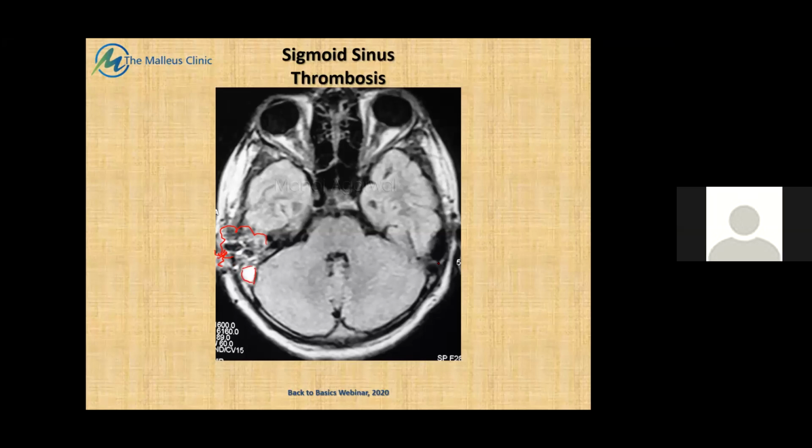You can see that the lateral sinus on the other side is not visualized even on contrast because of the rapid blood flow, but on the right side, because of the sluggishness of the blood flow, the contrast has accumulated in the lateral sinus, leading to a hyperintense shadow with a heterogeneous shadow in front, which is congruent with the area of the mastoid bone or the temporal bone. Okay.